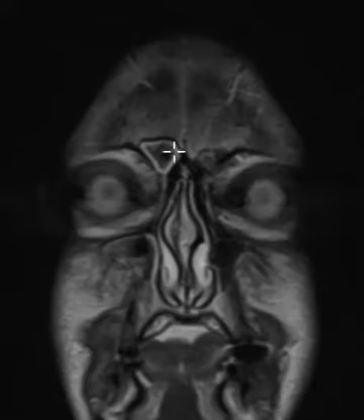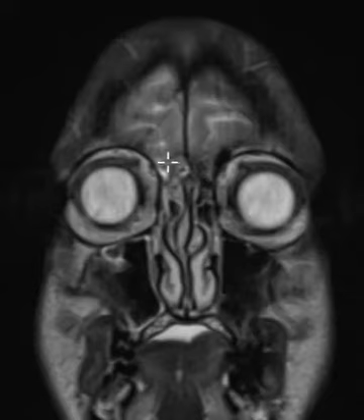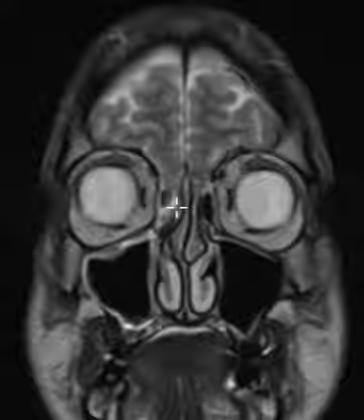But in this patient, there was a line of brightness around the periphery. This is a mild mucosal thickening or inflammation of that frontal sinus. The right ethmoid sinus is bright, so instead of being really dark, jet black like air and bone, like it should, it's filled with whiteness. So this is mucosal thickening throughout the ethmoid sinus on the right.